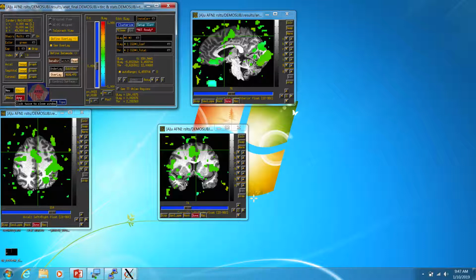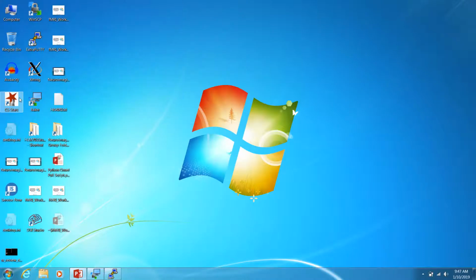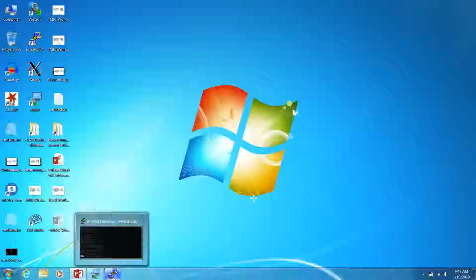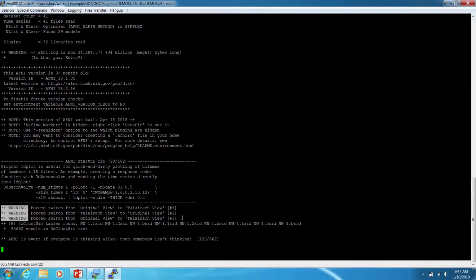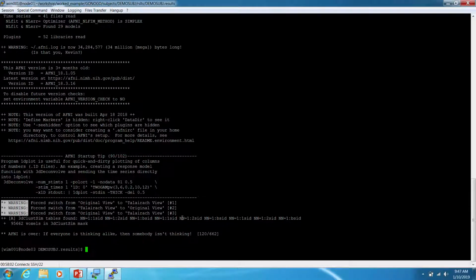That's the end goal of what we're running through. So I'm going to go ahead and close this. Now we're at the step where we would want to do QC review in our pipeline. So we get the email that our job has finished, and we want to go see if what we got was really what we wanted, or if there weren't errors in the analysis.